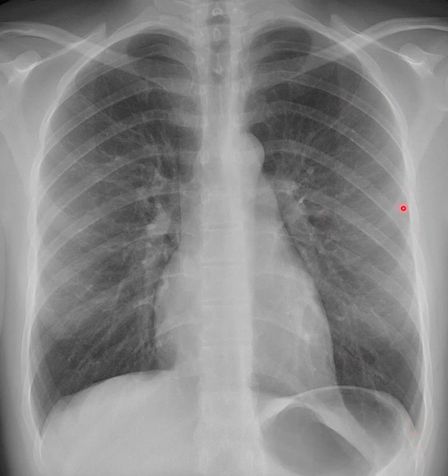Then I will go to the lateral borders of the ribs here to make sure that I can see both right and left lateral borders of the ribs, and I can. So I know that I have not clipped either the right or left lung from this image. Now that I know that I've got the entire lungs included in the image and what has to be shown, let's look at the different pieces of anatomy and structures and how they're supposed to be identified on the image to know that this is a diagnostic image that can be sent to be read by a radiologist.